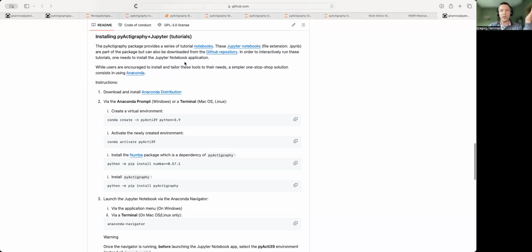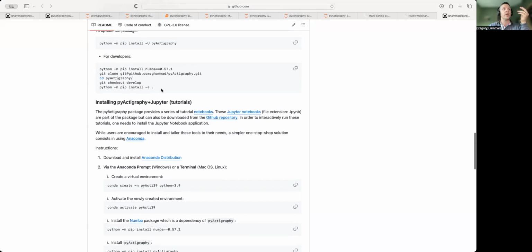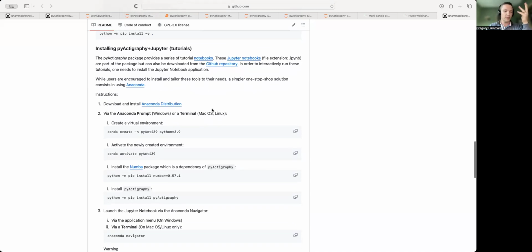The main point of this installation procedure, which is not the one that I was recommending so far, is the use of Anaconda. That's a software that is distributed by a company.